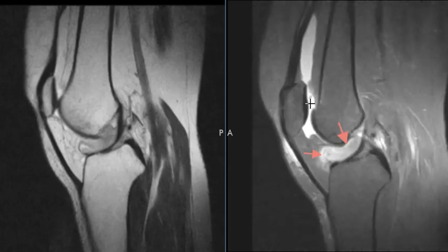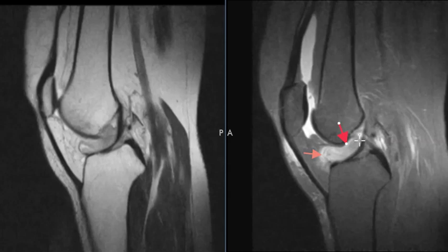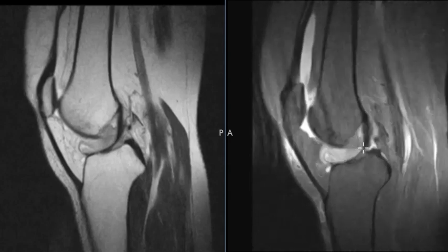This is a joint effusion, a moderate to large joint effusion, and we see how white this is, very uniform, really bright, and this abnormal process here is more gray. So this is a region of synovial inflammation. We call it a synovial pseudomass. It looks like a mass, it's not a true mass, or localized nodular synovitis, just synovium that has grown, proliferated in a nodular area, and it will cause fullness, pain, can cause knee locking and limited mobility.